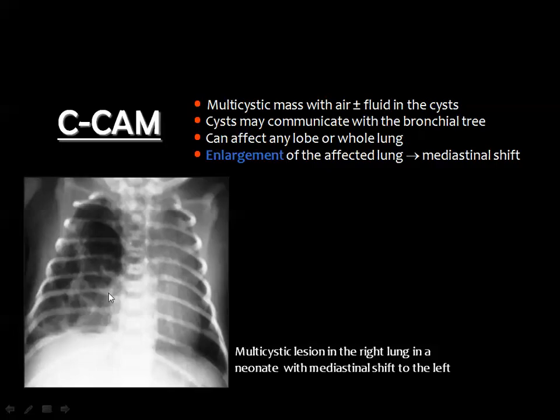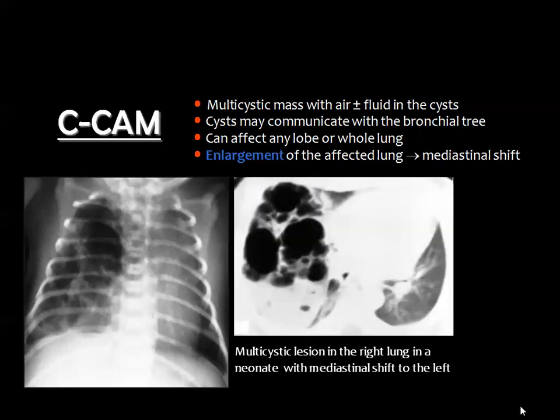And if you look carefully here, you see multiple air-containing cavities within the right lung field. Then the CT scan confirmed the presence of thick wall air-filled cavities compressing the remaining part of the lung and displacing the heart to the opposite side.